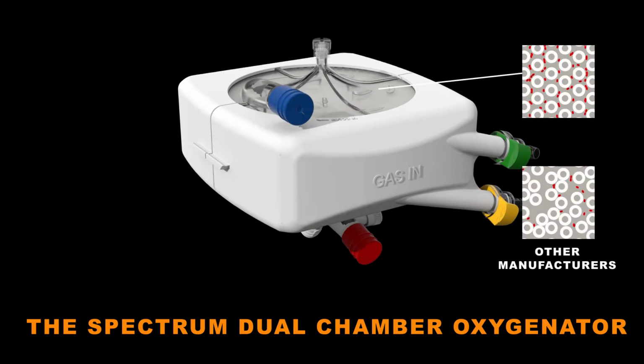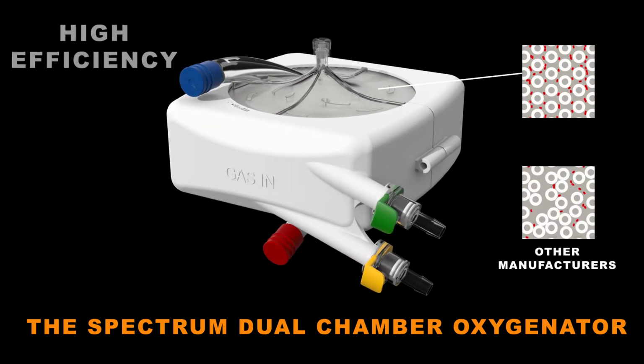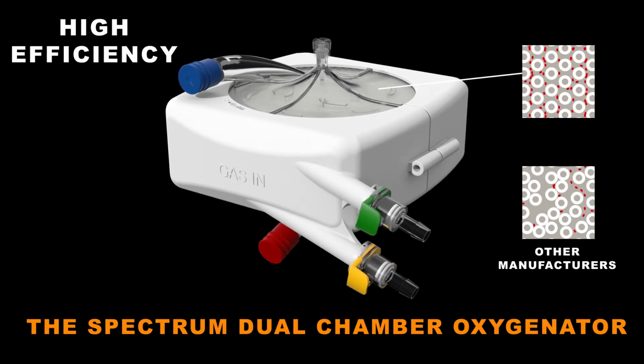Fibers are precisely positioned with spacers and maintained at the ideal distance from one another to achieve filtering while providing low shear stress values as well as high exposure of the red blood cells for optimal gas exchange per unit area of exposure.